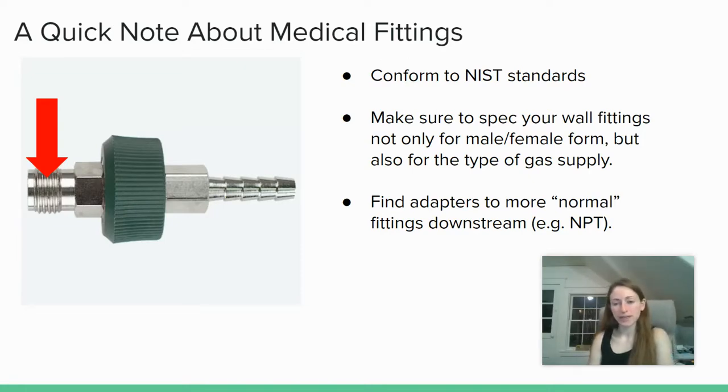That means that they're non-interchangeable screw threads. And what this means is that if I have O2 inlets and I want to connect to the oxygen at the wall, I don't want to accidentally be able to screw into the medical air fitting, so the screw threads are a bit different across the different gas supplies. It's like if any of you have flammable liquid containers at home, like propane tanks, you may notice that these tanks are reverse threaded, so you won't accidentally connect to them when you mean to connect to something else and cause an explosion. So it's the same type of concept there.